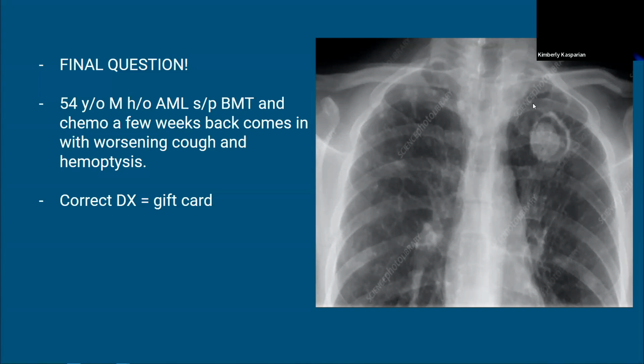What is the fungal ball called? Necrotizing granuloma? Oh, it's an aspergilloma. Yeah, I mean, whatever. But y'all are totally right.